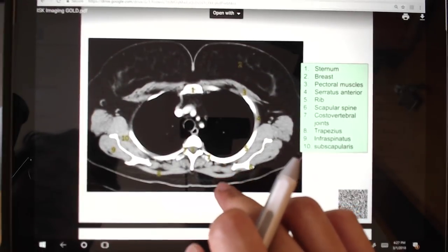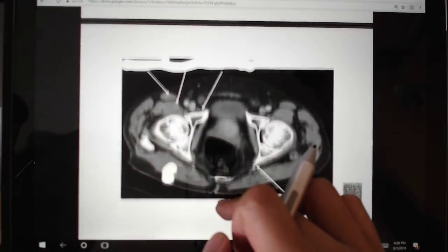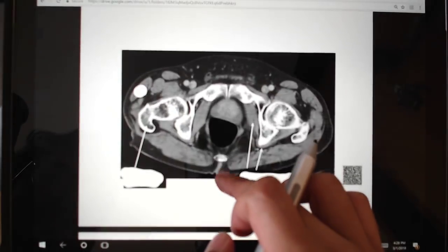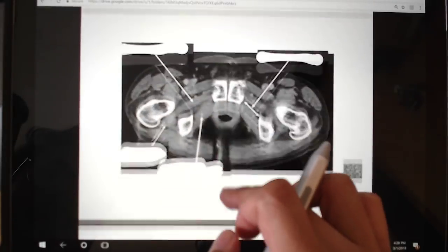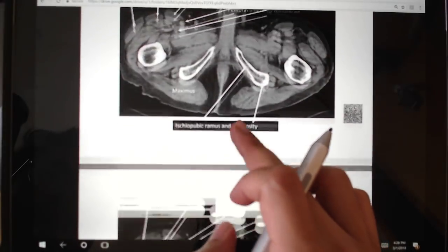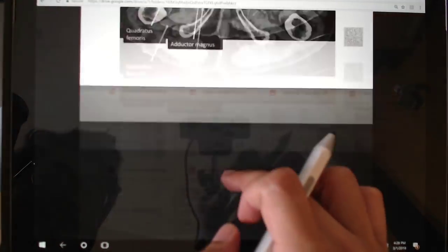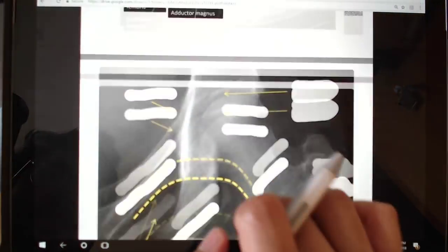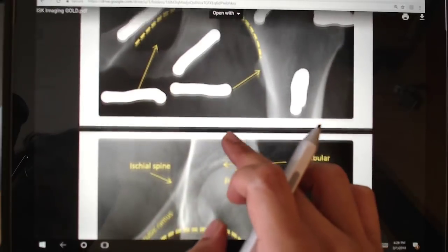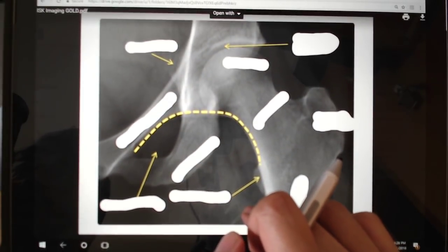Okay, let's skip a couple of these. Sorry, this is kind of on the fly, but these do come up a bit. That's why we're trying to make this a little easier. I was looking for the kidneys and stuff, but anyway, you can definitely tell easily by the bony landmarks where you're going to be.